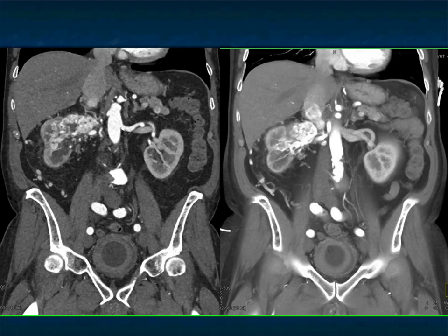In terms of tumors, papillary renal cell very rarely invades the IVC or even the renal vein because it's less aggressive. Most of the time it's clear cell. Now clear cells are more than 80% of renal cell carcinomas, but it's this neovascularity that really makes it easy. And in this case, it's into the IVC, renal vein, IVC, but not into the patient's right atrium.